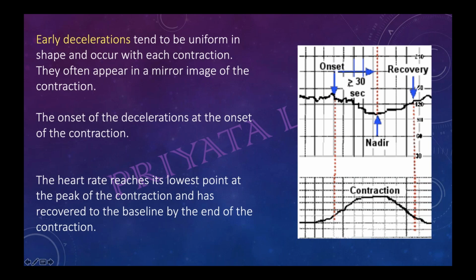This is one type of picture, but it is not always very easy to calculate, so I never explained it that way. Someone was asking this. But if you see it as a mirror image, with the tips coinciding, then answering becomes easier.